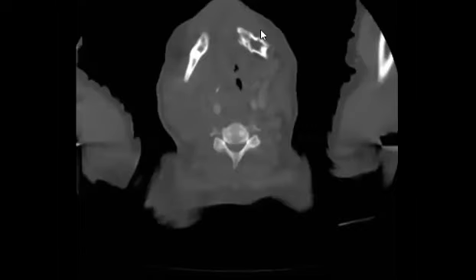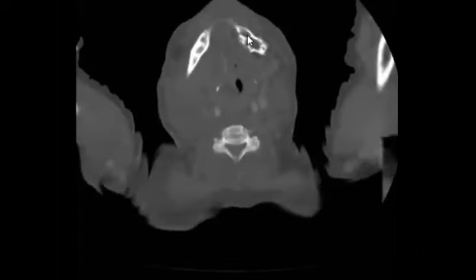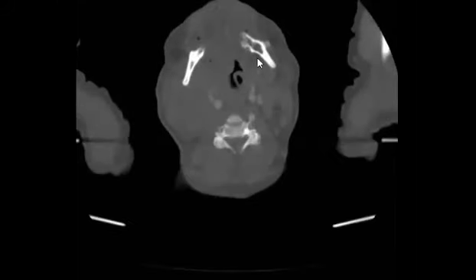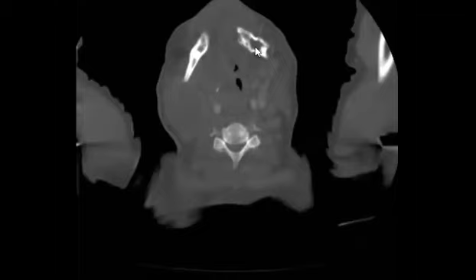So there is another problem here. Do you see it? Yes. So maybe again this mass is going and encroaching upon the bone, which is eroded at least. So we should mention that it's eroded. It can be a metastatic process, sclerosis, or rarefaction.